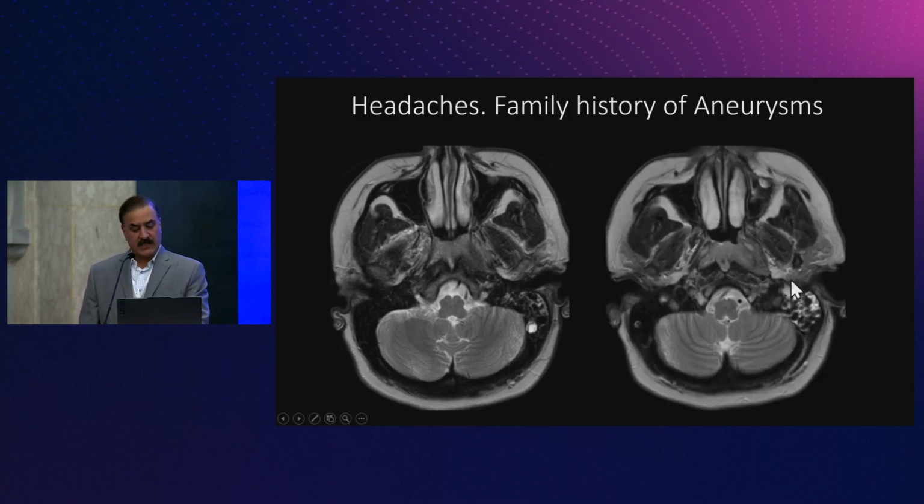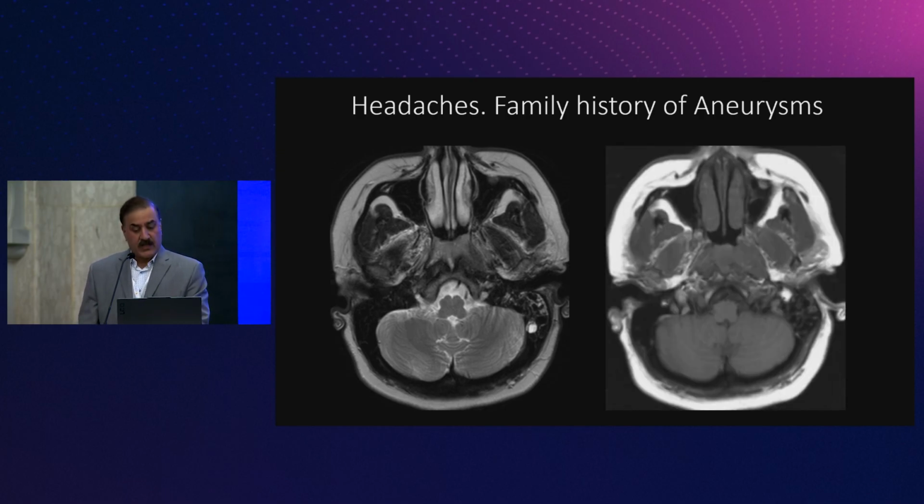Then this is a year later, and you can see the opacification of that sinus has gotten worse. You can see now a much bigger mass in the nasopharynx on that ipsilateral side, missed again. This is the T1 of that. You could see it very nicely on that T1. Fortunately, this was still within the pharyngobasilar fascia, so even a year after, this was still T1 disease.